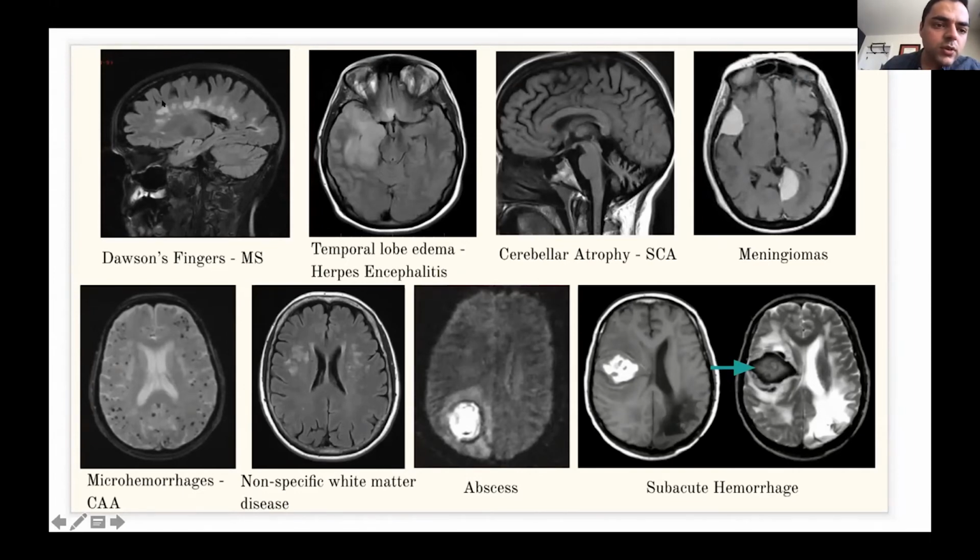So here you see white matter, the axons are dark, and we know that's T2. The CSF is also dark, so this must be a T2 FLAIR, okay? So you always want to take that first step just to identify what you're looking at. And here we see signs of MS. So you see hyperintensities in the white matter spaces. That's a classic sign of MS.